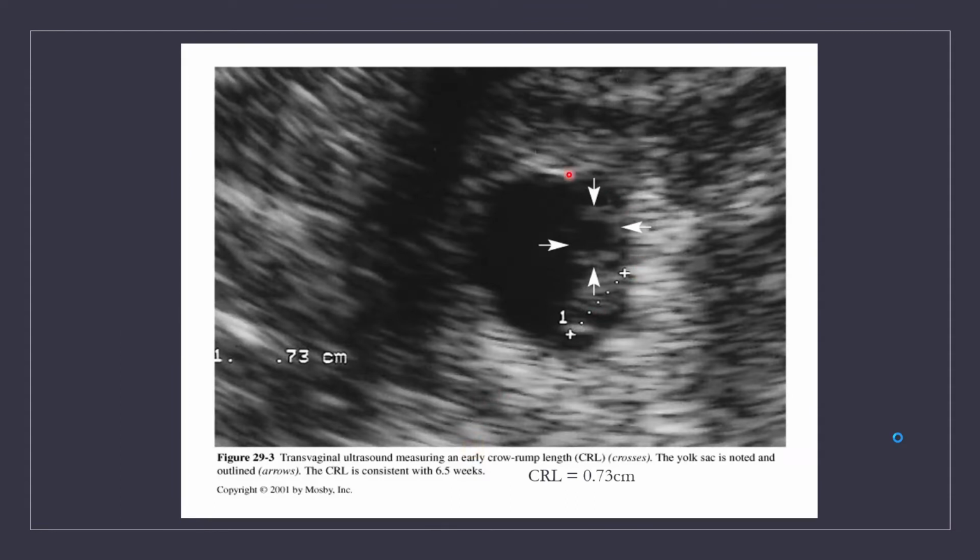Okay, this is another zoomed up image. And remember when I said make sure when you're doing that crown rump length, or I may not have said, if I haven't, here I'm saying it now. So the yolk sac, we want to make sure we do not include that yolk sac in that crown rump length measurement. So this is the embryo here, and again, I know this is a very difficult image to see, especially since you're just starting to learn what ultrasound looks like. But it's just because it's really magnified. But this is the yolk sac that it's pointing to. All of these arrows are pointing to the yolk sac, and then the actual embryo is here. So you would not want to include that yolk sac in that crown rump length measurement.